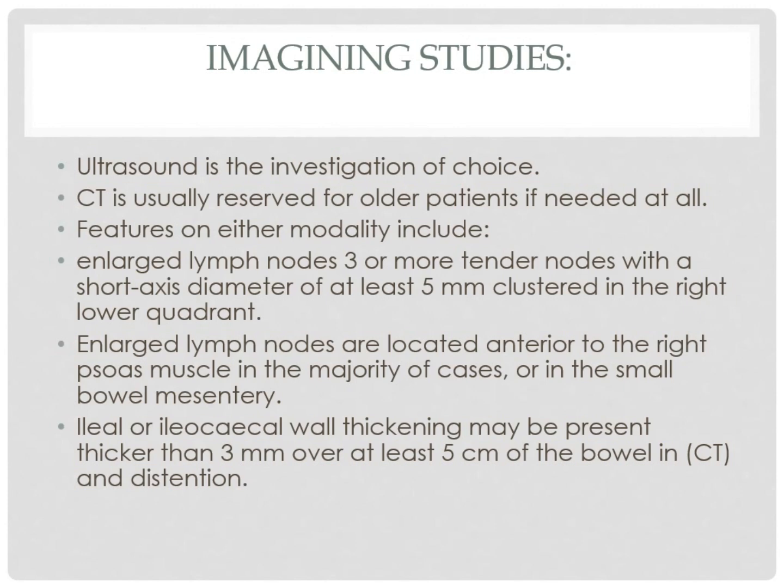The thing is, always measure the lymph node in the shortest axis, or shortest diameter, or shortest dimension. Never write a lymph node measuring 3 by 12 millimeter. This is wrong, wrong, wrong. If you see a lymph node 4 centimeter in length and 2 millimeter in diameter, you write a lymph node measuring 2 millimeter in shortest dimension. You never measure length.